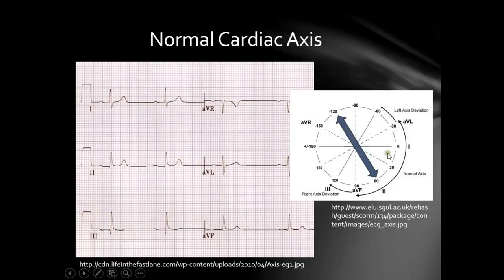So that means your cardiac axis must be pointing towards those leads 1, 2, AVF, and 3. And so your cardiac axis must be pointing to the positive 60 degrees and not to the minus 120 degrees. And you can confirm that also by seeing that AVR is negative, so it's pointing away from AVR. So again, the biggest advantage about using this isoelectric lead method is that you have a reference number, which is that the cardiac axis is at a 90 degrees angle to the isoelectric lead.